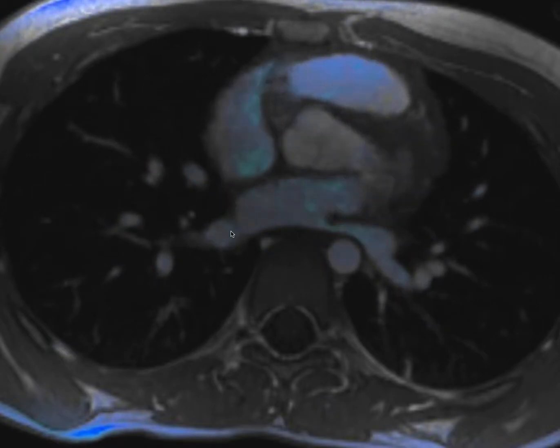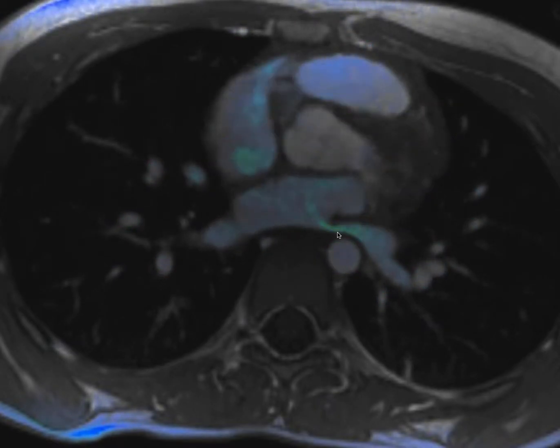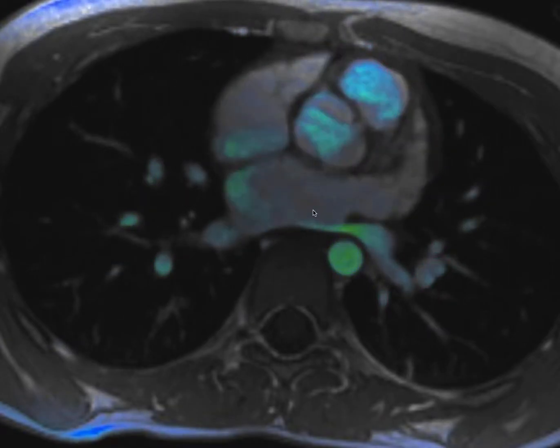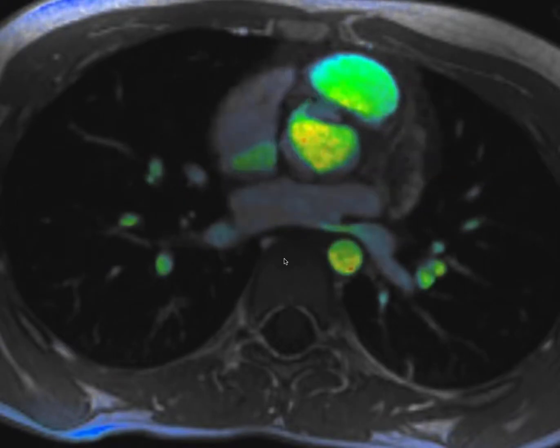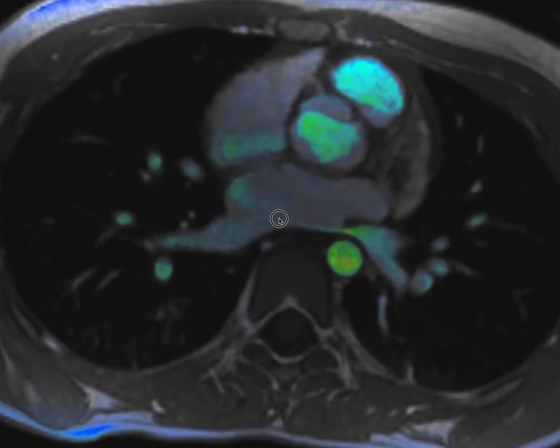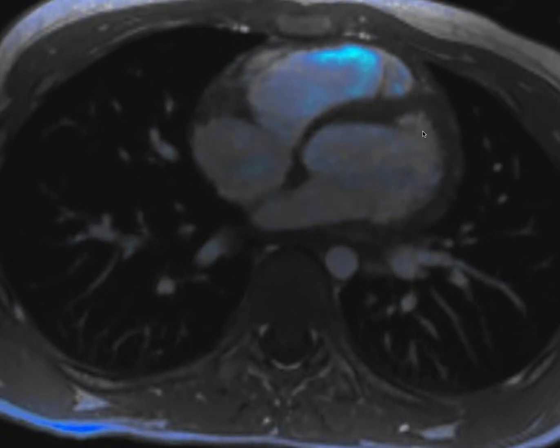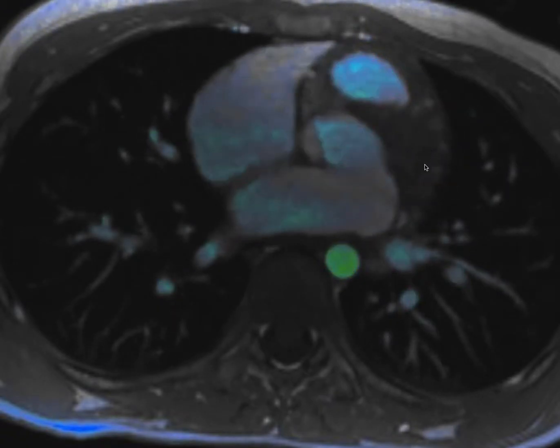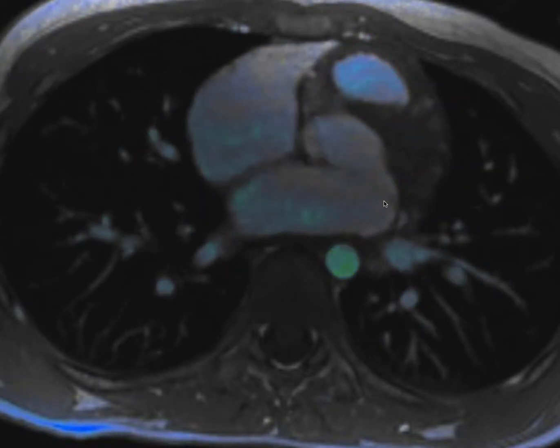So just for now, ignore the other veins that I'm not showing you. But here you can see the right inferior pulmonary vein and left inferior pulmonary vein, both going to the left atrium. Now that the blood has gone through the lungs, it is oxygenated. This oxygenated blood then goes from the left atrium into the left ventricle. So here's the left ventricle, and the valve that you see it passing through here is the mitral valve.